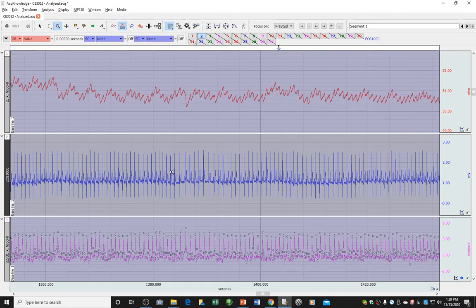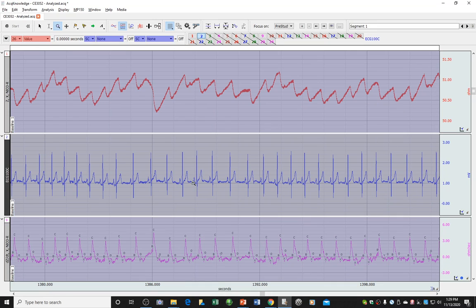And as we zoom in, we'll see there's this periodicity to the data, much like the ECG signal, which you're likely going to be more familiar with. Each one of these spikes here is your R spike in the ECG signal. And you'll see up above there is a similar degree of periodic movement in the impedance signal. So what we're doing is we're measuring the degree to which an electrical signal put into the body is impeded in the thoracic cavity, that chest cavity. And that tells us something about heartbeat dynamics.